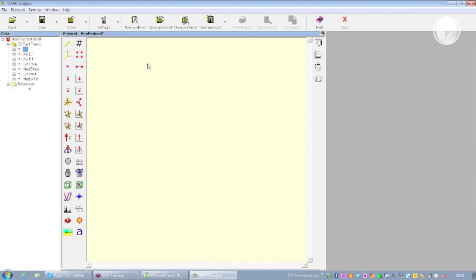First of all, it is important to interpolate a kinematic track because we want to have all the track complete. What does it mean to interpolate the track? It means to be sure, applying a certain algorithm, to have the complete track with no holes. So I don't want to have holes inside my track.